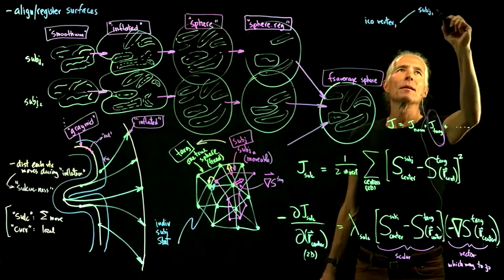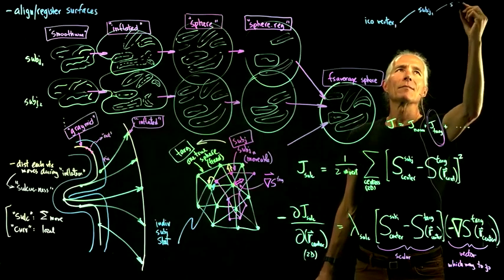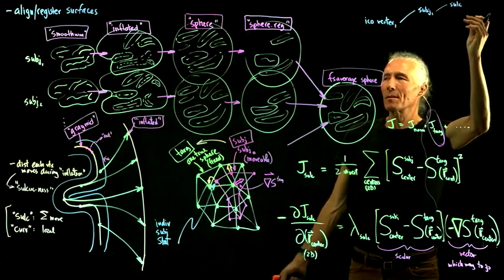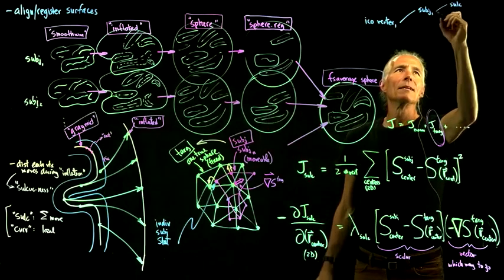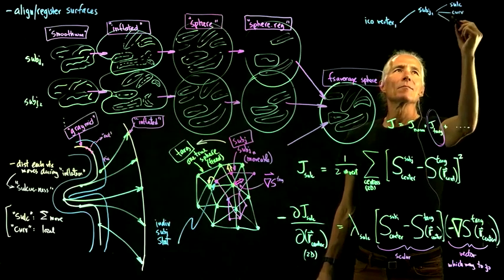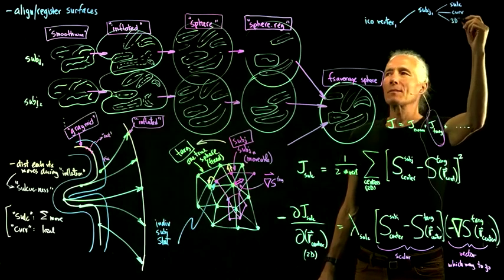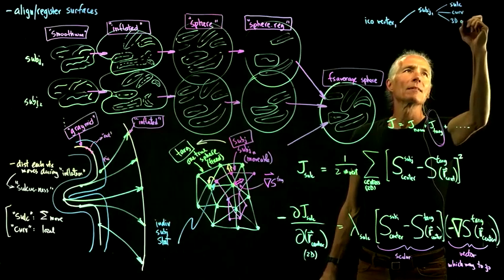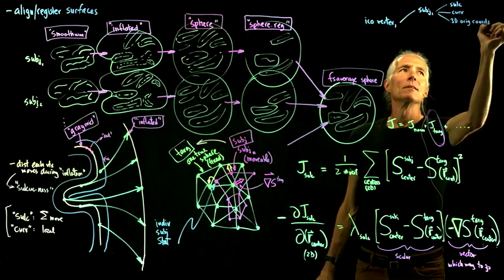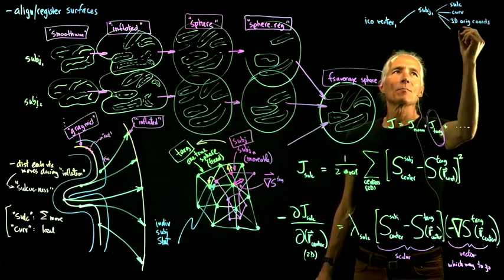So there'll be whatever the sulcus measure was, because that won't necessarily be the same as the target. And what the curvature was, what the 3D coordinates of the vertex were, the 3D original coordinates. This will be useful too. There'll be some stats.